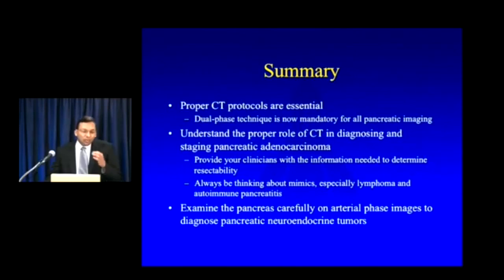Secondly, when you're looking at these cases, I think it's really important that you understand the role of CT in terms of both diagnosing and staging pancreatic cancer. It's not enough when you're looking at a pancreatic cancer case to just say to your surgeon, well, there is a cancer there, period, right? You have to give your clinician the information that they need in order to determine whether that lesion is resectable or not. Always be thinking about mimics, right?